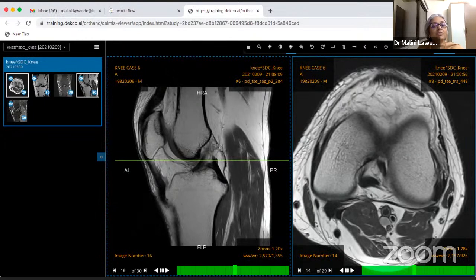So it's important that we use a larger field of view. Normally, see, the scan is ending here. We keep a smaller field of view so that resolution is good. When you increase the field of view, the resolution of the image gets poorer. So if you're suspecting quadriceps tendon pathology, you need to mention it in your note so that the technician makes sure that more of this is included. That way we can see where the tendon is retracted and give you the exact gap.